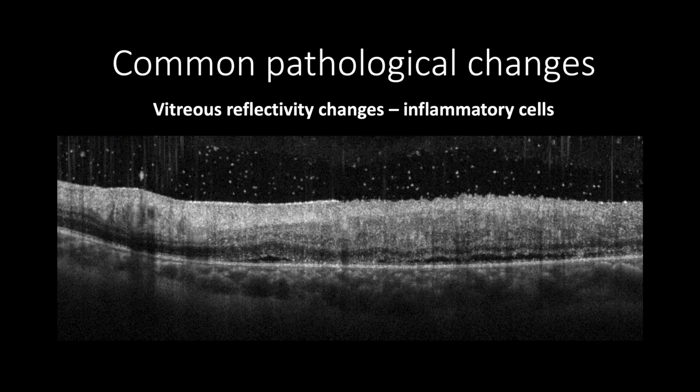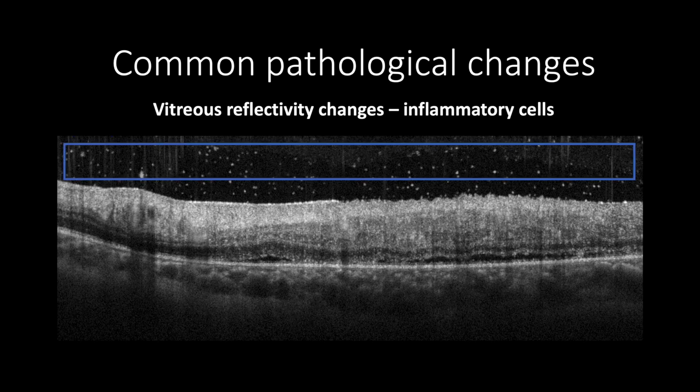In contrast, this OCT cross-section shows hyperreflective dots in the vitreous resembling inflammatory cells from vitritis due to Behçet disease, along with corrugation and increased reflectivity of retinal tissue, as the former feature is due to the proliferation of the epiretinal membrane, while the latter feature is due to ischemic changes due to vasculitis. Another feature of this cross-section is increased retinal thickness and subretinal fluids.